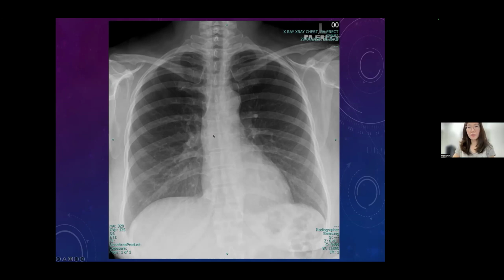Okay, so when we can't find any abnormality, always remember to look again at our review area, right? Review area. So from the lung field, both sides first, whether the intensity or opacity is fairly symmetrical, whether there's any opacity in either side of the lung fields. Okay, if there's none, then we look at the costophrenic angle, both sides. Yes, Jiaqi, yes, right apical pneumothorax.